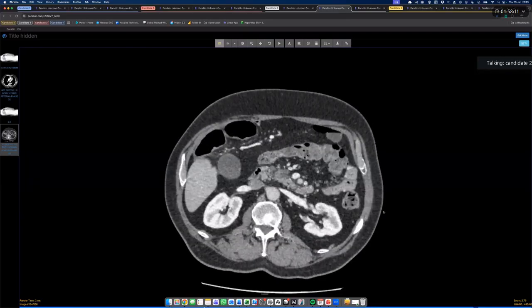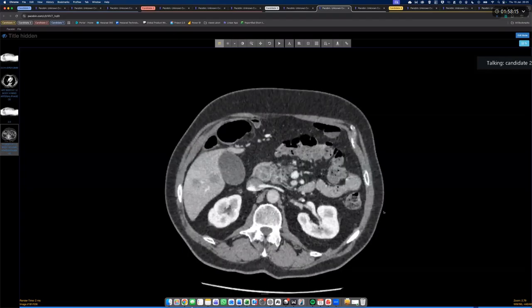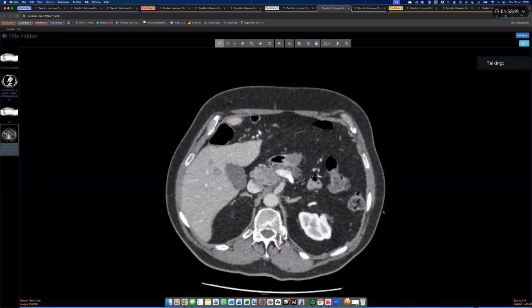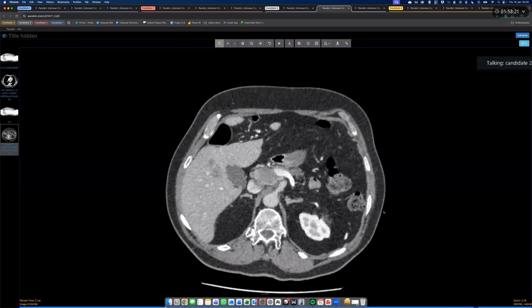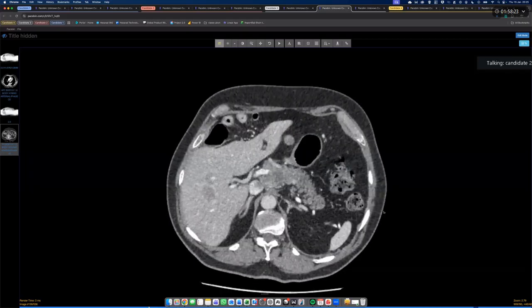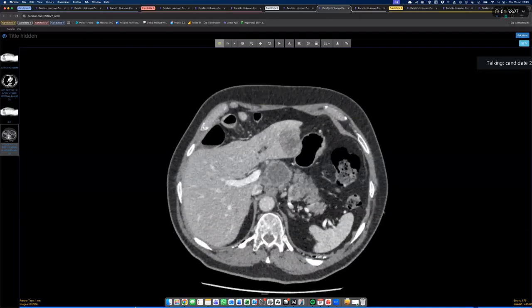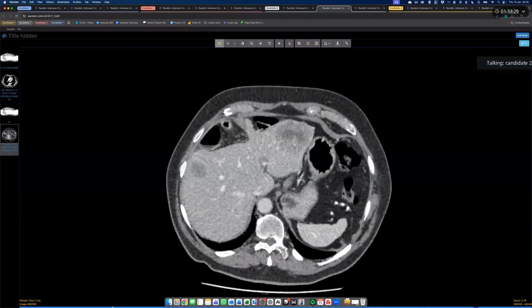It is lying anterior to the infrahepatic part of the IVC. The portal vein is passing through the anterior part of this mass, which is causing its compression, but no definitive portal vein thrombosis could be appreciated.